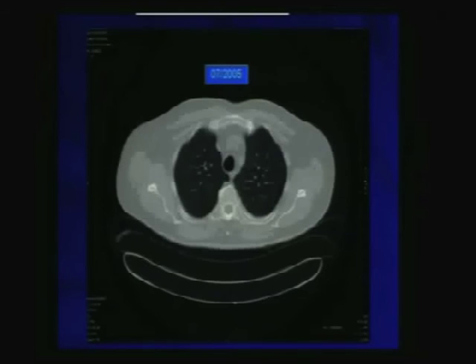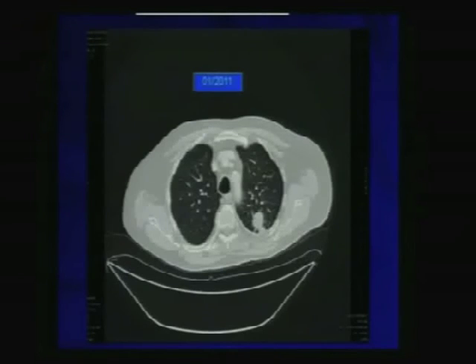If I go to 2005 now, it was smaller in 2005, got bigger in 2007, then got smaller again in 2008. What do you do? You have to go to the very first CT or X-ray to make sure that you do see a true evolution. You cannot compare it just to the most recent one, because this is what happened and this is what I did. And the patient came back in 2011, and this is an obvious tumor that has metastasized.